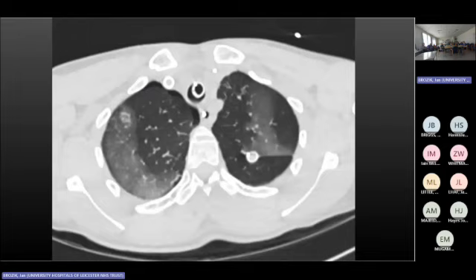This is the process of understanding what we are looking at. So ground glass. Ground glass could be from A to Z. It could be alveolar hemorrhage. It could be bronchoalveolar, today is adenocarcinoma. It could be pneumonia. We'll say viral pneumonia, PJP. It could be radiotherapy induced. Yeah, you can get pneumonitis. You can have interstitial lung disease. It could be anything. Yeah? But we need to get to the bottom of things.